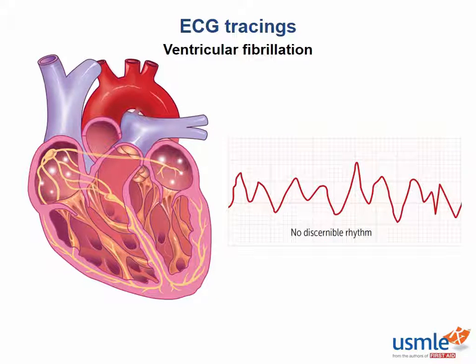The next rhythm we're going to discuss is ventricular fibrillation. Ventricular fibrillation is a very dangerous and quite horrifying rhythm to see on an EKG. Now I will say, if you see this rhythm on an EKG, your patient is probably not doing so well, and you're going to have to act quickly.